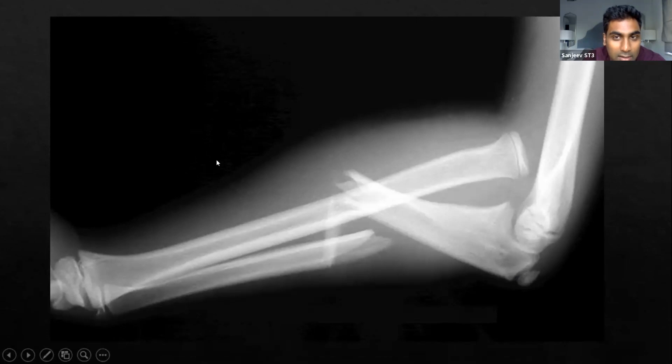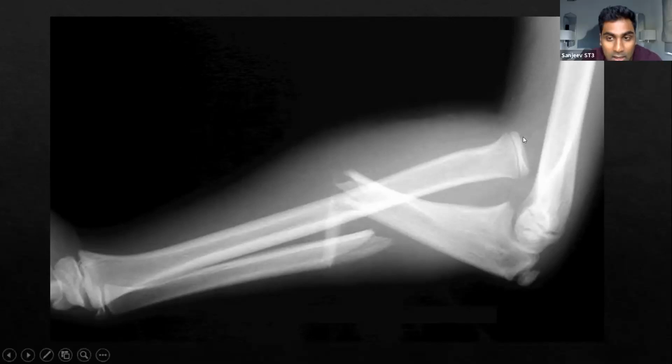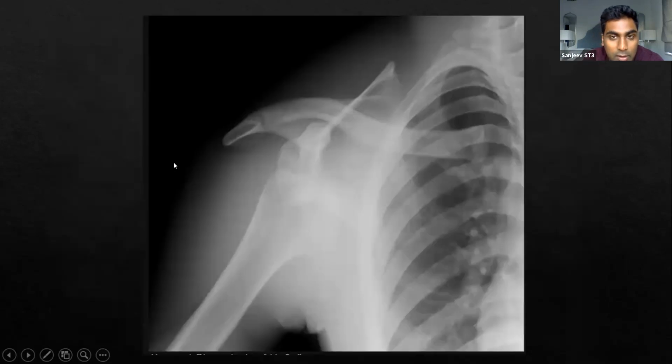So can anyone explain what those lines may represent? Child. Yeah, exactly, it's a pediatric X-ray. So don't get thrown off, which is why I included this image, don't get thrown off by pediatric plain films. They shouldn't give you a pediatric one, but just in case they do, remember if there's multiple lines going through the ends of the bone, think this is a child, ignore that. They will give you an obvious fracture to focus on, okay? Good, have you got any other questions?